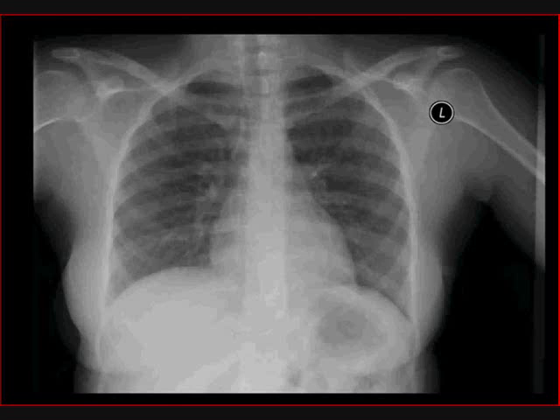Then we should go on and make sure that all the ribs are normal, that there's no destructive osseous lesion or any areas of sclerosis. Look at the clavicles, sternum, and shoulders. In this case, the osseous structures of the thorax are grossly normal. Then we look at the soft tissues of both the lateral chest and also the neck. And lastly, we look at the upper abdomen to ensure that there's no free air under the hemidiaphragms.